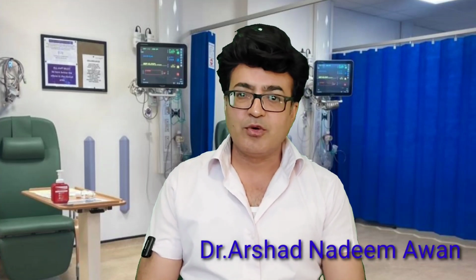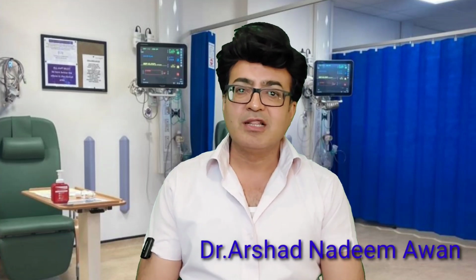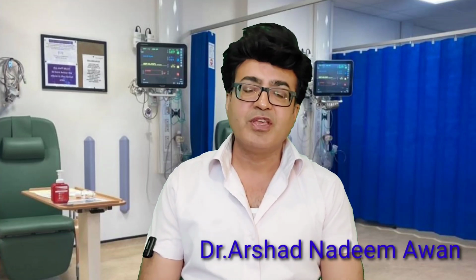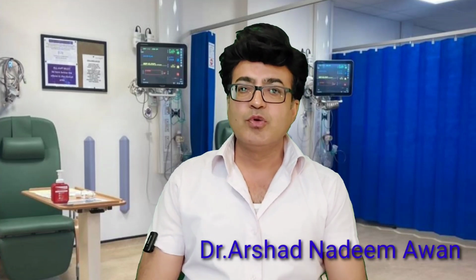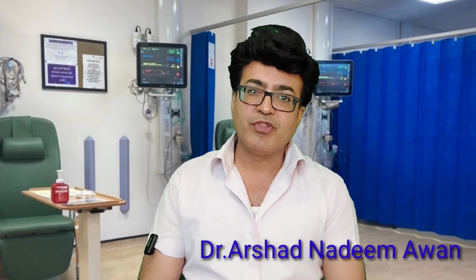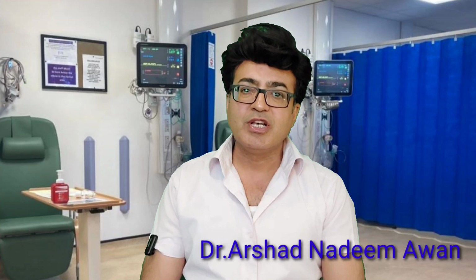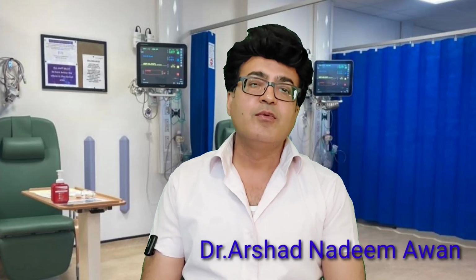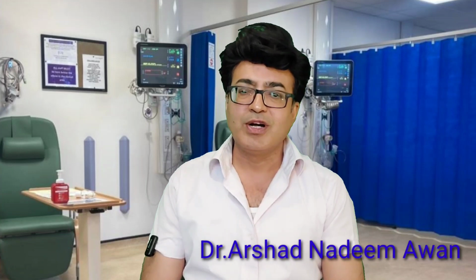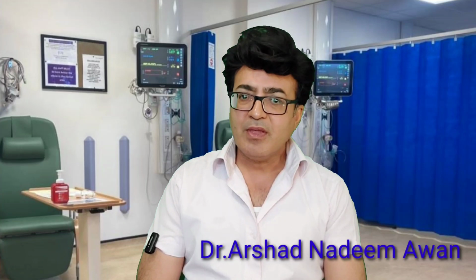Doppler plays a vital role, as you all know, in picking up thrombus and intraluminal thrombosis. Ultrasonography and Doppler ultrasound particularly is a very important and specific tool to look for blood flow. There will be either sluggish or absent blood flow. If it is totally occluded, there will be absent flow, and if it is partially occluded, there will be sluggish flow. So these 2 points you can pick up on Doppler ultrasound imaging.